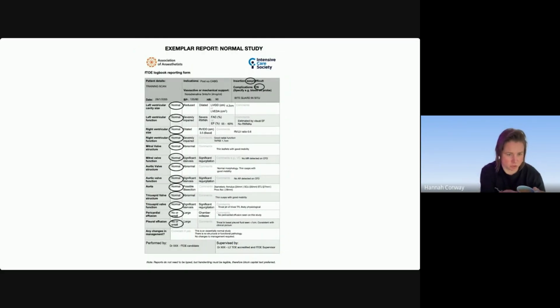Very recently, I've just provided an exemplar report, which I think should now be uploaded to the newest accreditation pack. And I just wanted to use a normal study because the expectation is that you still need to report normal findings, which is something, unfortunately, that hasn't shown through on some of the exam candidates that we've seen. And obviously it's up to us to provide that guidance. So in a normal study, the expectation would be for you to obviously do the circling of normal, but also to use descriptors. So for example, here we've got right ventricular function. You could put normal, but actually it'd be really important to say why you've come up with that assessment.